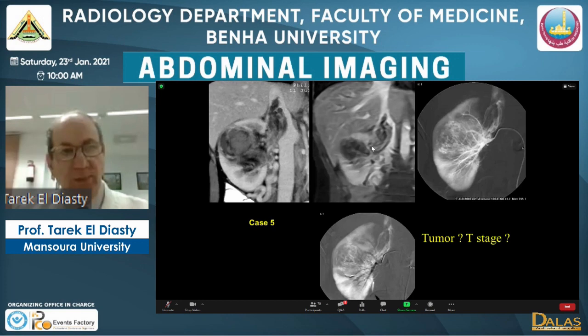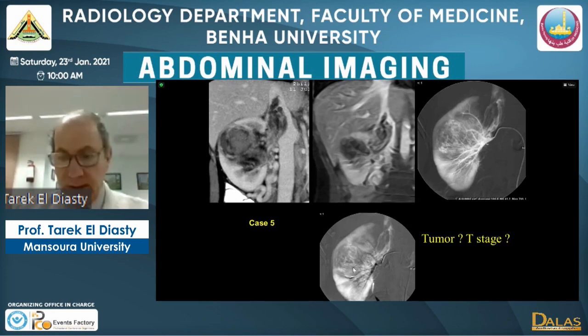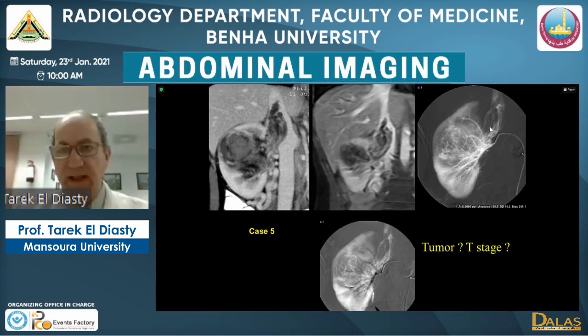The angiomyolipoma with an abundant amount of fat can extend to the vena cava like the renal cell carcinoma, and also can extend into the perinephric fat. This is a typical angiography of the angiomyolipoma with microaneurysm on renal angiography, and we can also see the defect of the renal vein and caval thrombus.